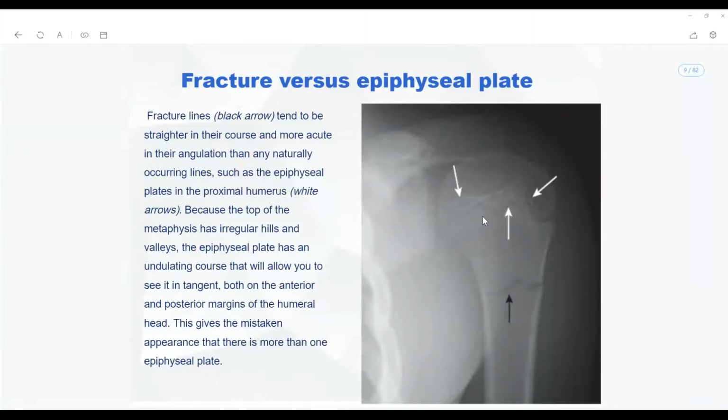So in this x-ray, once I came to understand that I'm looking at the left shoulder, I try to analyze if I'm looking at a child or an adult, because the humerus has got the ossification centers. The ossification of the humerus generally happens after 10 years.